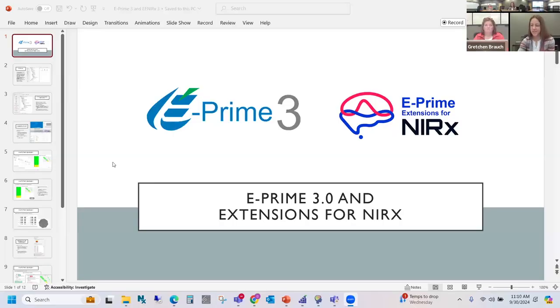Thank you, Franzi. I'm going to go ahead and share my screen. Okay, so as Franzi said, I'm going to go ahead and do an overview of the E Prime and extensions for NIRx software.